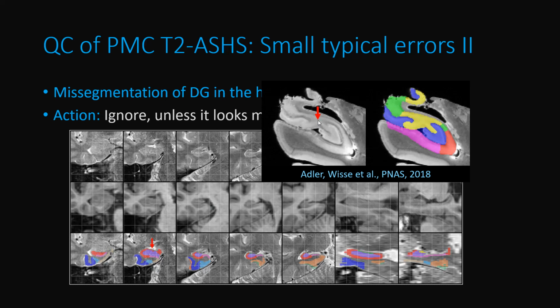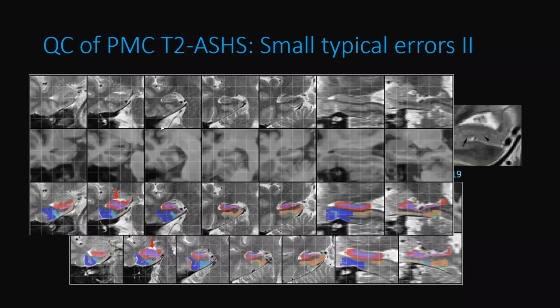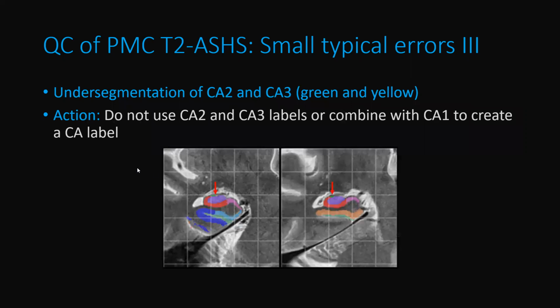So I think it makes sense that the segmentation method is making a mistake there, because the dark band is not quite as clear and sometimes not even there. That, of course, would cause some problems. And again, this is not the case in all examples. In this case, it's completely fine. So it happens, but in general, it's not a big problem.